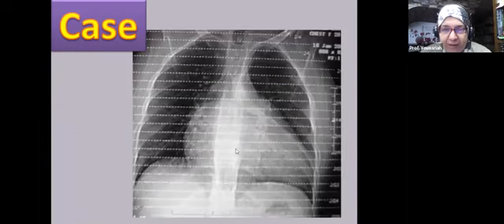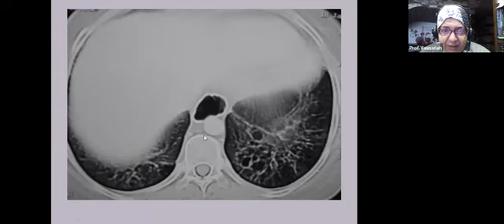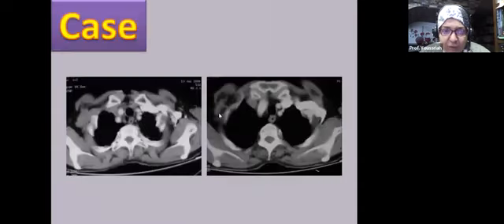What do we see here in this scanogram? If you look up, you see the trachea, and surrounding the trachea, there is another lucency, which goes further down here, till the upper abdomen. This is a dilated esophagus. And you can see here, this is a dilated esophagus all through. All through, we have a dilatation of the esophagus, and down we have interstitial fibrosis and cysts. This is a 20-year-old female patient with scleroderma. Total dilatation of the esophagus all along.